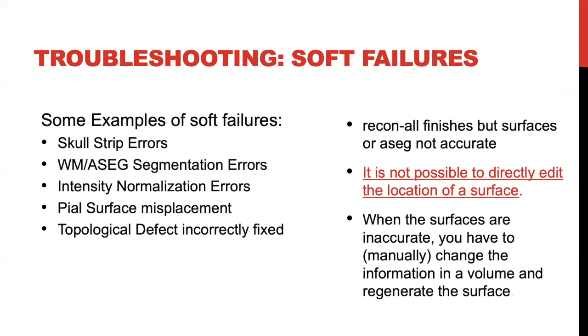But essentially, to fix the errors, you cannot fix your surfaces directly. As Deb mentioned, FreeSurfer labels different surfaces for your data. However, you actually need to go into the volumes and change the volumes, then rerun recon all, and that will regenerate your surfaces.